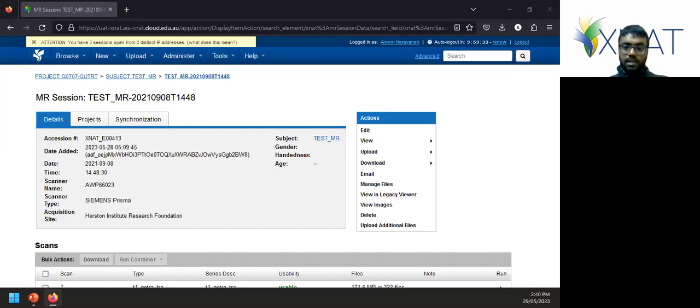Okay, so there's two questions. One's, can I upload Twix data this way? The answer is yes. There's a caveat. I'll address that at the end of the talk. Is there a way to automatically upload raw data and attach it to a scan? You can do it via this. This is a manual mechanism, but you can set the custom uploader for your scans. So now it is manual, but you can do it more streamlined. That's the only option at the moment. And we are looking into options to do automated upload from the site, but that's not in production yet.